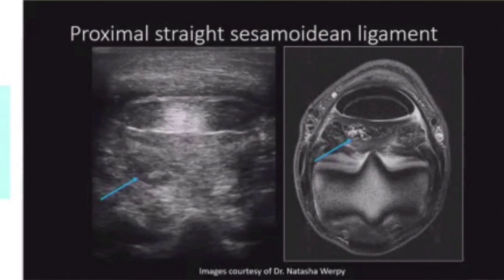So just the MRI really helps because it helps us see that these do exist in a really challenging area. You can see how subtle the finding is on ultrasound compared to MRI. So even if you say, I think I'm going to have a hard time finding these, I've had some that have had an MRI. I know exactly where their lesion is, and when I go to ultrasound it, I still can't see it.